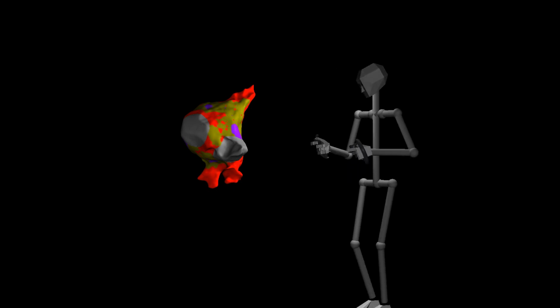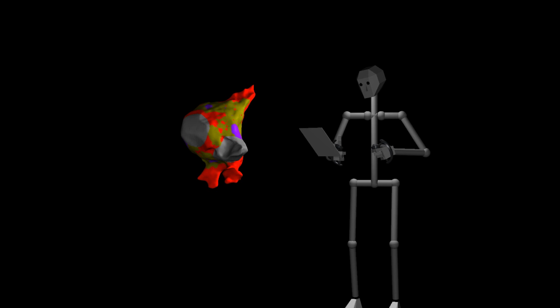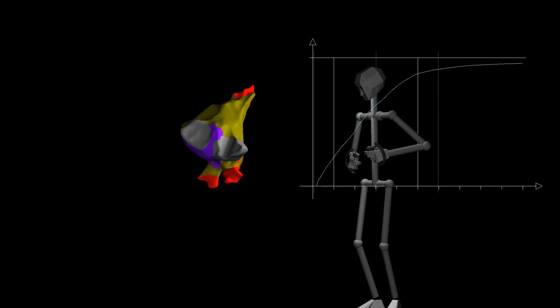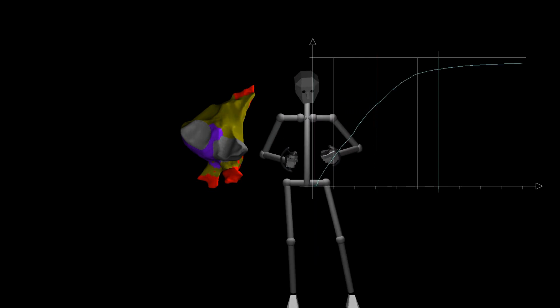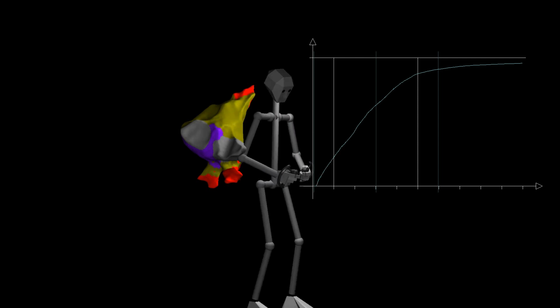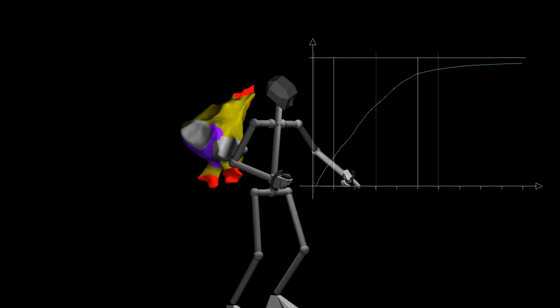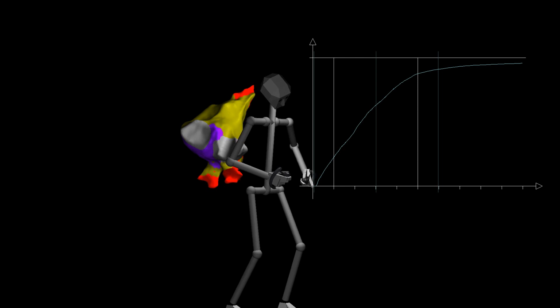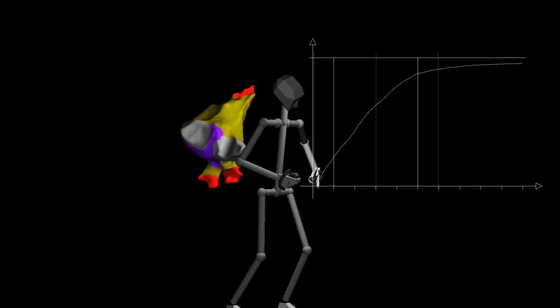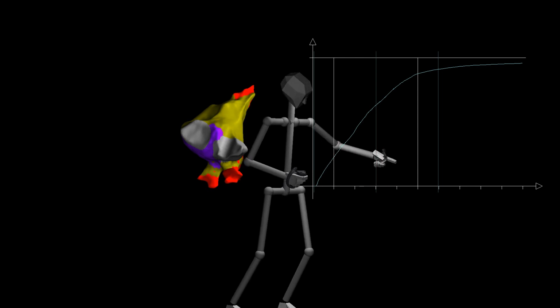We can also look at this a little bit more quantitatively by bringing up, and I'm going to first show the pre-voltage mesh, a graph of the distribution of these measurements. In this graph, we have voltage going on the horizontal axis, where this is 0 millivolt, and each of these ticks is 0.1 millivolt. So we have 0, 0.1, 0.2, 0.3, and so forth.